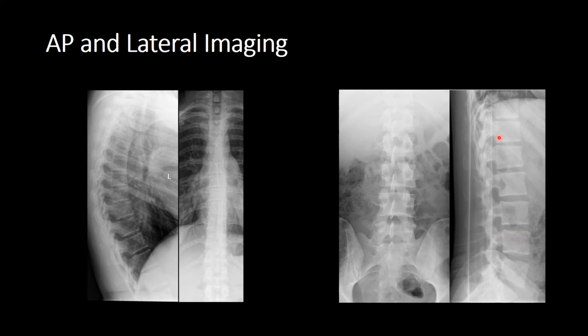Now you can get slight wedging around the thoracolumbar region, which is normal, okay? In this particular patient, we can see the slight wedging of L1, but actually this is not abnormal, this is a very normal picture. So get used to looking at the thoracolumbar junction and what the normal appearance of the vertebral bodies in that location is.